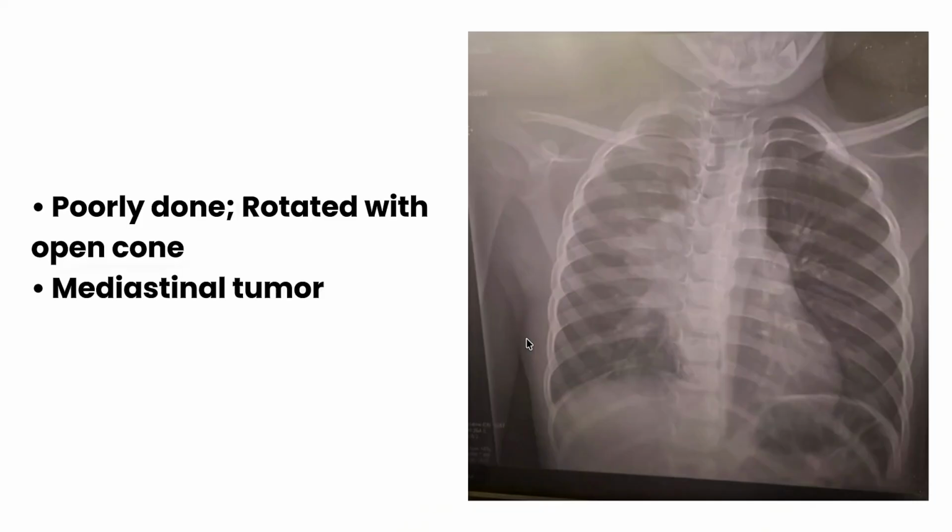When I go on and look at the second image, again, you'll agree with me that this second image is not of the best quality. Of course, there is that preferential alteration in density. Probably the patient was not straight, but this was a child, and usually it's difficult to get an appropriate image for children. Most of the time we use what we have.